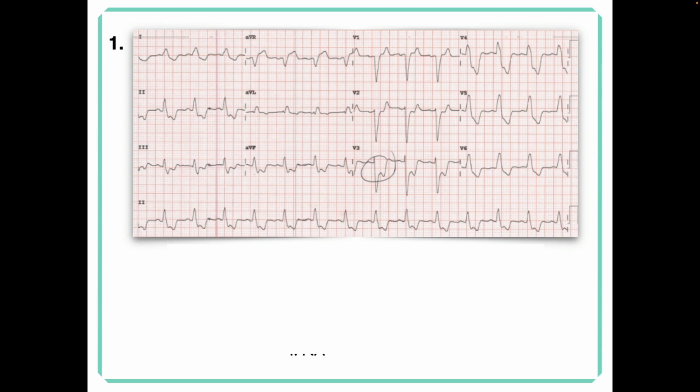So tell us which leads you're going to look for Sgarbossa A. A is anyone with upright. So what are those? Lead 1, lead 2, lead 3. I'm not sure about lead 3, but you might as well look. This one's pretty equiphasic, doesn't quite count. Majority upright, and then a little bit in V5 and V6. Okay. So any Sgarbossa A?